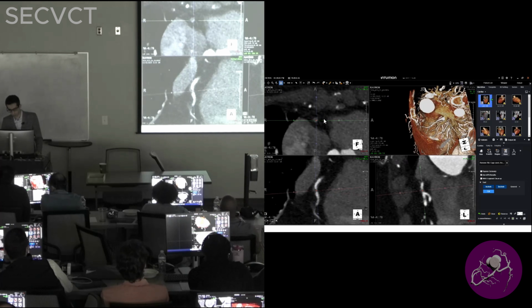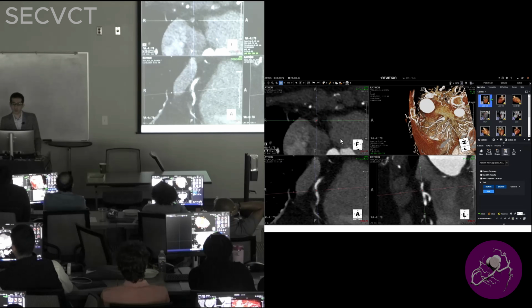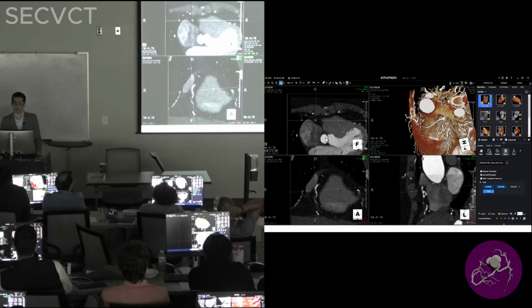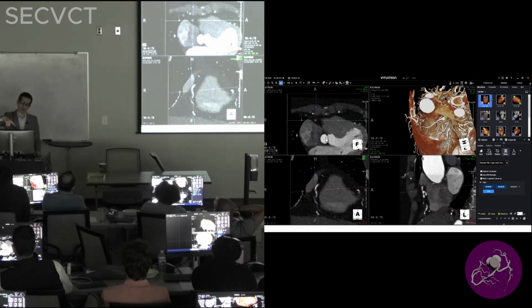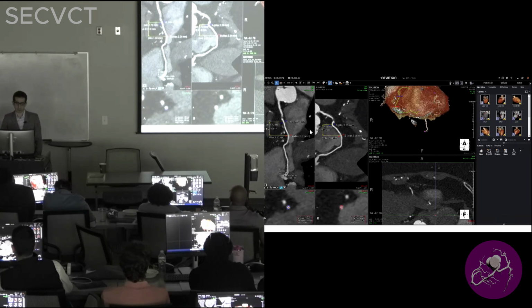Is this severe, moderate? We talked about it in the morning. When this looks almost gone, the artery is almost occluded. The question is, is this severe or subtotal occlusion versus CTO? One of the tricks we did in the morning was we looked at the gradient, the difference of the Hounsfield unit distal to the lesion, whether it goes down naturally or goes the other way, from distal to proximal, because of some collateral. So this is the lesion that we are concerned about. If you see my cursor, is that subtotal, like 99%, versus a CTO?